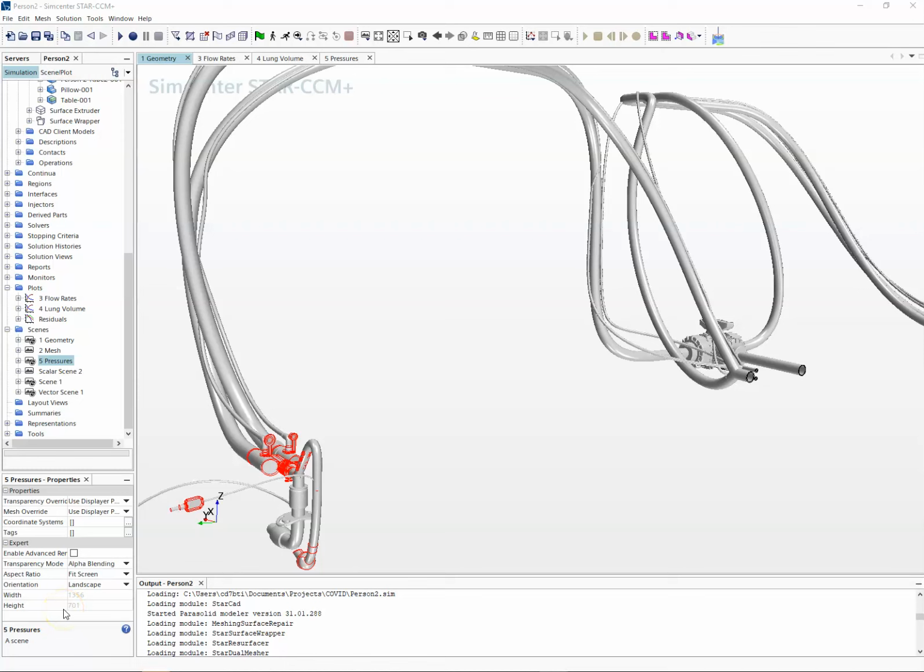When it comes to the medical space, one important question is how can we use CFD simulation to support experimental therapies? For this simulation, we're looking at a ventilator that was originally designed to support a single patient, but we've bifurcated it to support two patients simultaneously. So the first thing we want to verify is how the pressures, flow rates, etc. are performing.